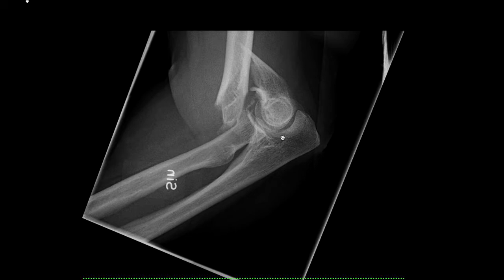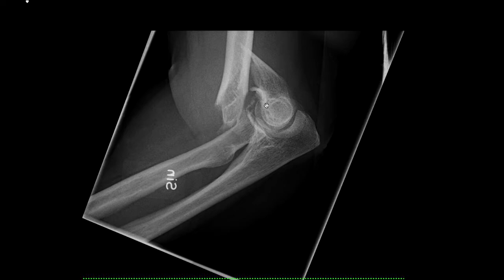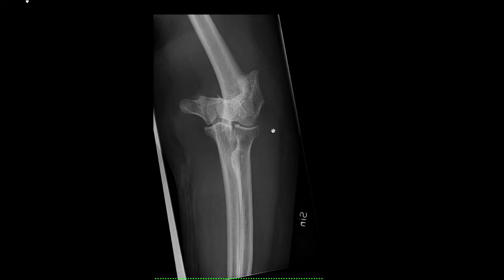So, for example, in this patient, the humerus is completely fractured distally, and on the other angles, you can see that it's pushed forward. But when you report, you want to say that the distal part is dislocated dorsally, so pushed backwards. We only have 2 images in this patient because I guess he didn't have enough energy to give us better angles. So let's see what else we can see on elbows.